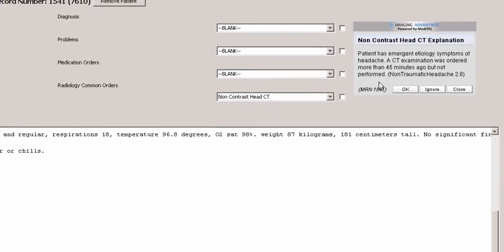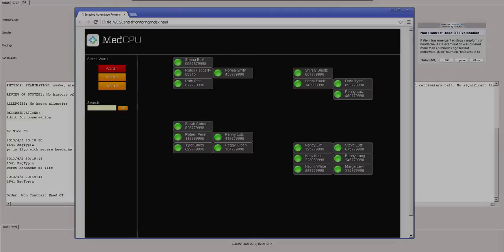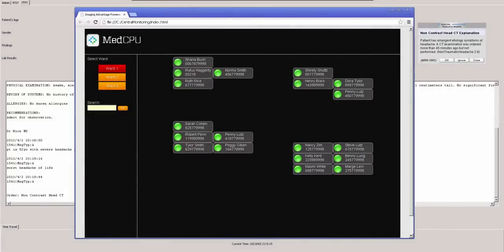In addition to the advisor button at the bedside level, the application also has a central monitor, which can be located at the central nurses station, a physician lounge, or any other central monitoring location. The central monitor is used to escalate the prompting to a central location, to allow activation of the chain of command if a deficiency becomes critical and is not dealt with at the bedside level within the expected time frame.